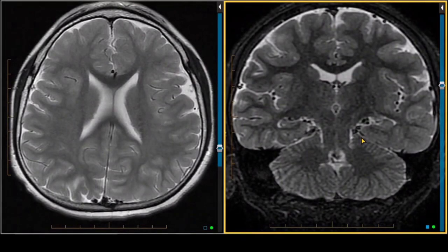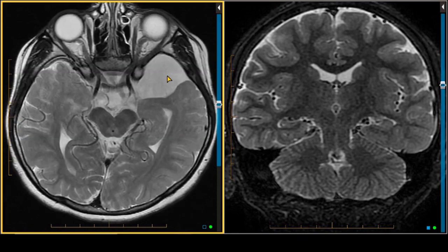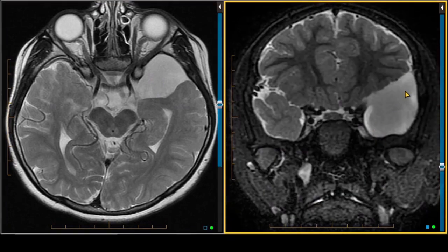This is an MRI scan in a 7-year-old child with headache, and at the level of the body of the lateral ventricles, there's normal symmetry between both cerebral hemispheres, and everything looks okay. If we go inferiorly, we see this prominent area of bright signal on T2 weighted imaging. If I go anteriorly on the coronal STIR, we also see the anterior aspect of the left middle cranial fossa is filled with fluid and is also actually, if we look at the transverse dimension of the anterior aspect of the left middle cranial fossa, it's slightly larger than the anterior aspect of the right middle cranial fossa.